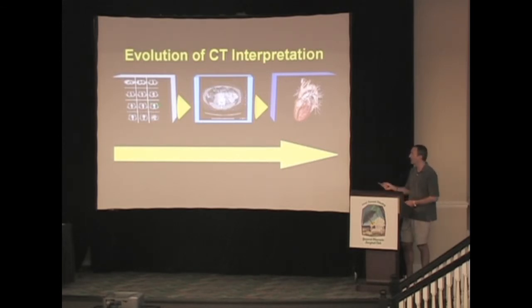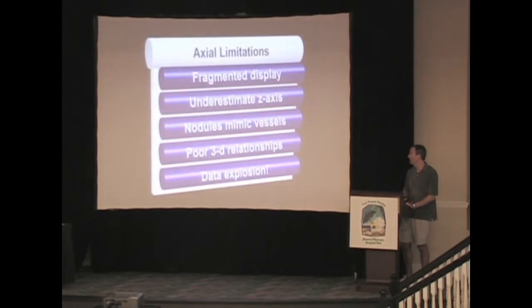So back when I was a resident and even a fellow reading hard copy where they would print 12 or 24 images on a page, to where now we're reading at a PACS station, and we're really getting into more tailored type of imaging. This is a 3D image of the heart done with EKG gating, but looking more towards tailoring imaging, organ-specific, question-specific.